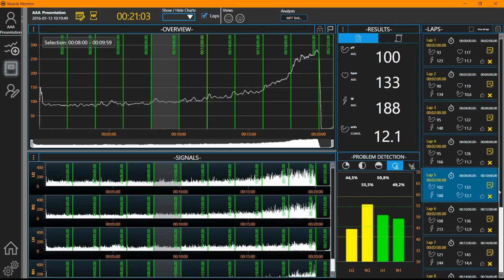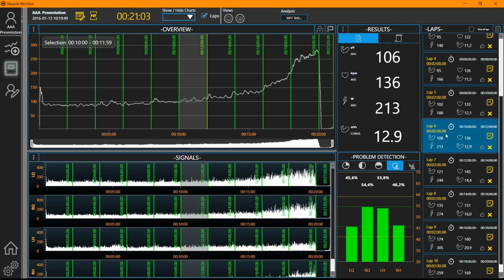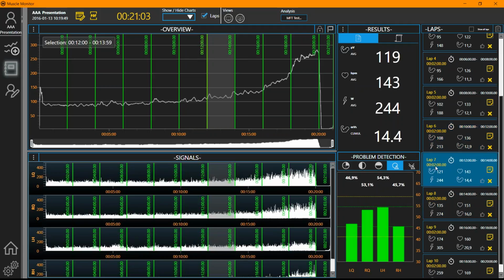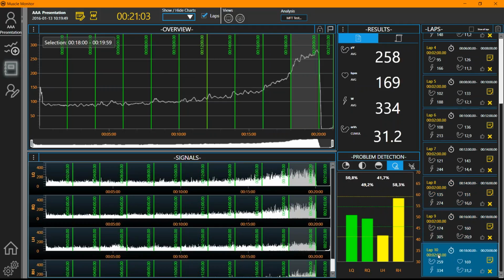The hamstrings are okay. It balances out, and the balance stays quite good until the very end. So in the last 2 minutes, you can see that the balance in hamstrings gets quite bad. But this is one way to look at this balance.